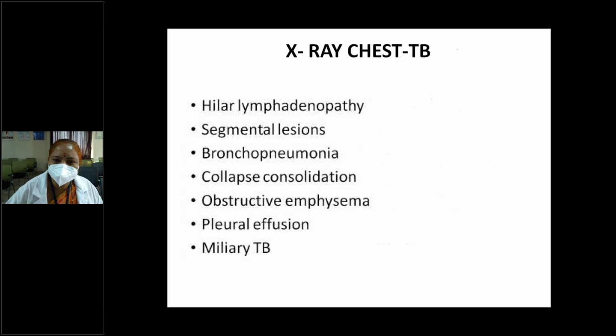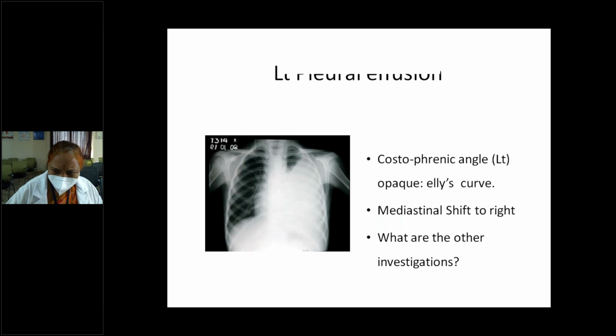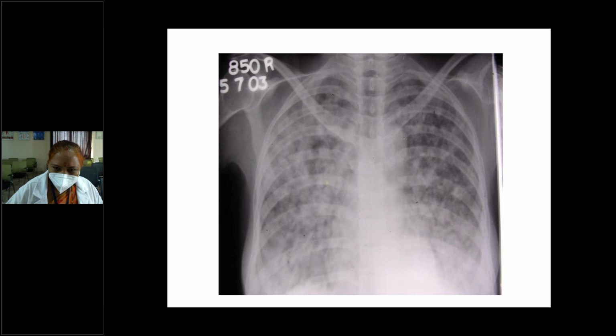All the X-rays up to here are over, I think 23rd onwards. Any doubts about the previous X-rays? If anybody has any doubts, you can ask me.